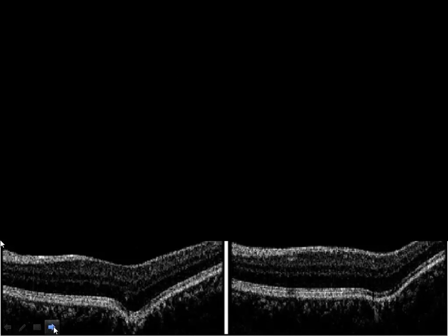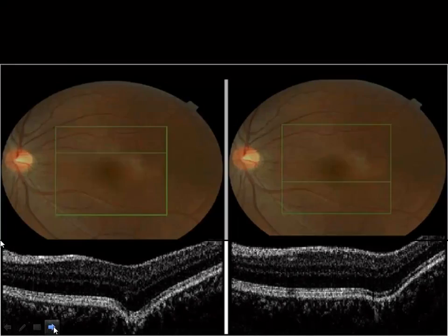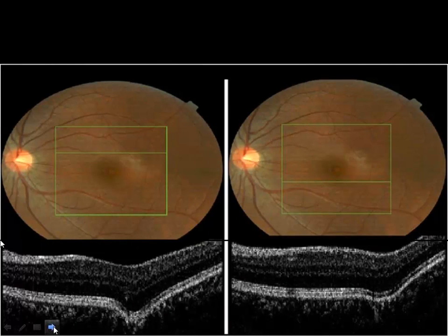How about this myope, a student of mine? She's a 7 diopter myope in both eyes. She has 20/20 visual acuity. Here's her left eye. We're taking a section above the macula here and a section below the macula here. And although her fundus looks normal, she actually has this, which looks like a mini bulge, 2 mini bulges.